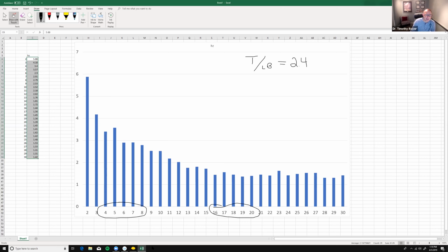Now, if we look back at where I was, about a 2.1 or 2.2, that's a little bit lower. But a way to look at this would be to say, if the average of these is sitting right around 3.1, right in here, then I would expect that the average of this, to get this ratio, would be somewhere slightly above 1.1.